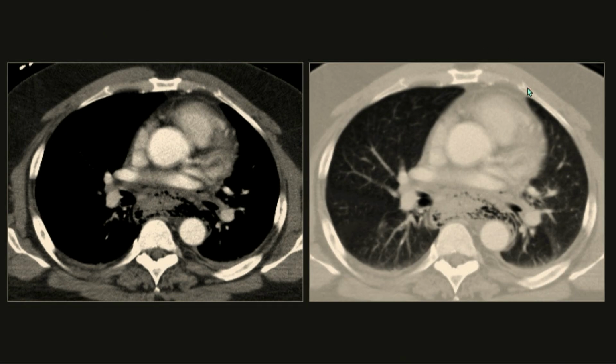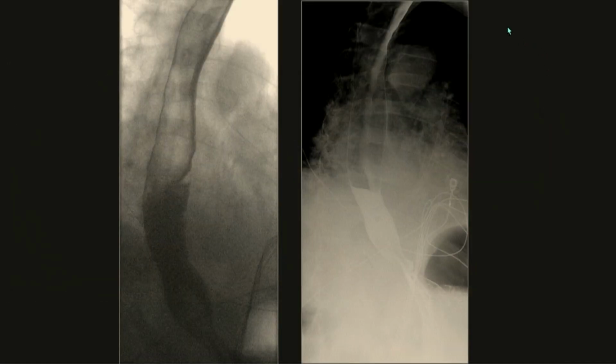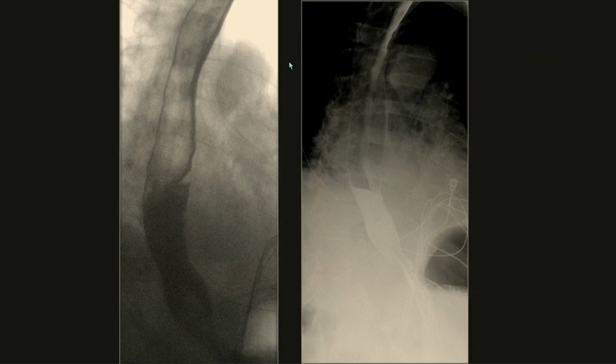And so this is a patient who came in with a very impressive tear of the lower esophagus and all this extraluminal air. Definitely expected to find something, right? So I took this patient back, did a fluoroscopic esophagram, could not find the leak, but kind of unsurprising. Take a look at that patient's habitus: quite sizable, difficulty with positioning, sick patient. So maybe you found yourself in this situation, felt a little frustrated, wished you could find the leak.